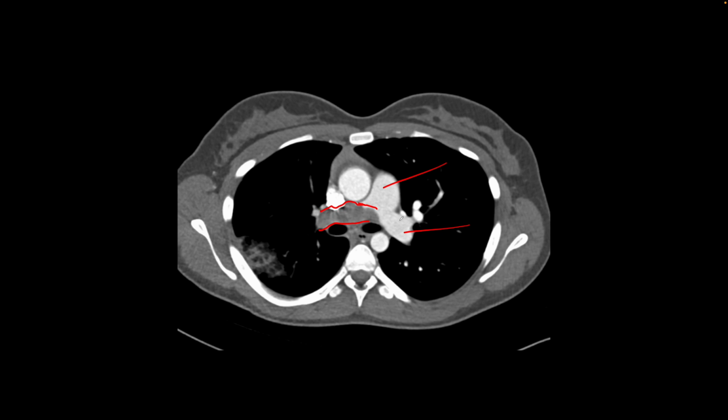the symptoms persisted after the initial treatment. And so because there was a long history of patient symptoms, a tumor was suspected and an FDG PET-CT was performed. Here we have some changes in the lungs from a developing infarct in the right upper lobe.